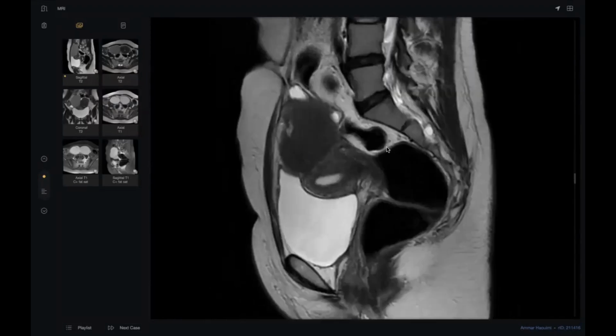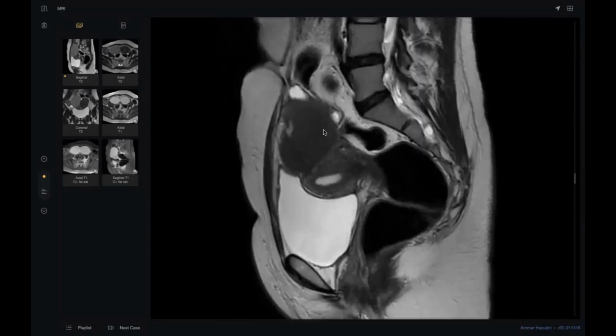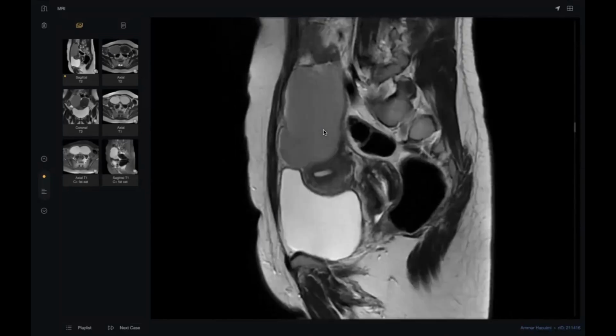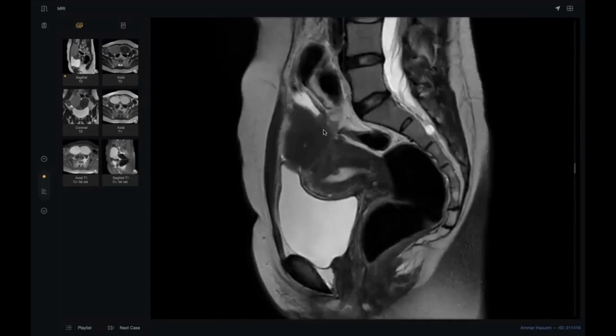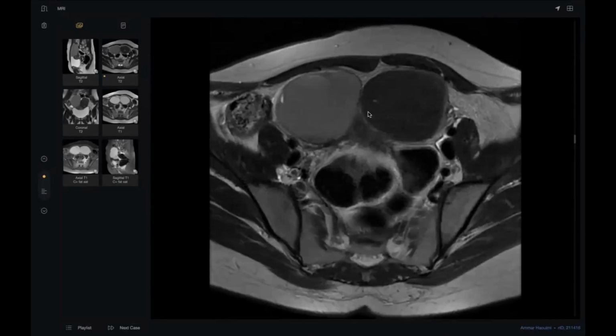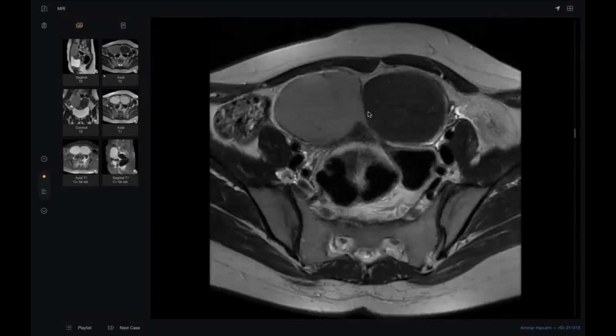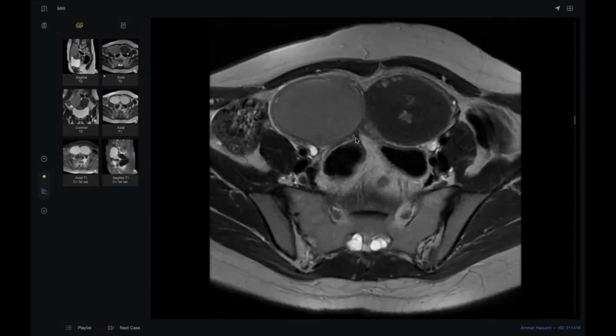Not an important question. See here, this is abnormal, my colleague, to see the rectum adherent to the ovarian endometrioma. Like here, this is due to deep infiltrating endometriosis in the cul-de-sac. This is kissing ovaries in endometriosis. Here, this is the clover leaf sign due to fibrosis.